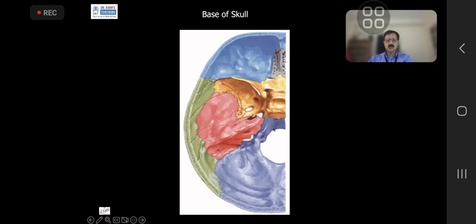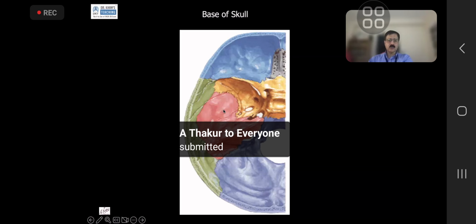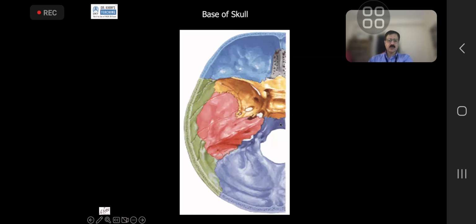Now, concentrate on this. This is what this case is about, because what happens in this case is that it erodes from the nasopharynx into the intracranial cavity, and it takes out many things. Now, on this axial, this is the sphenoid bone, this is the temporal bone, and this is the occipital bone. Occipital bone has various parts. The clivus is part of it, and this is the squamous portion. This sphenoid bone, of course, this is the posterior clinoid process. This is the pituitary fossa. You can imagine that the cavernous sinus is sitting there. The pituitary will be sitting here.